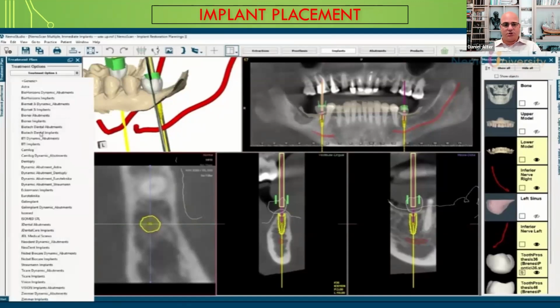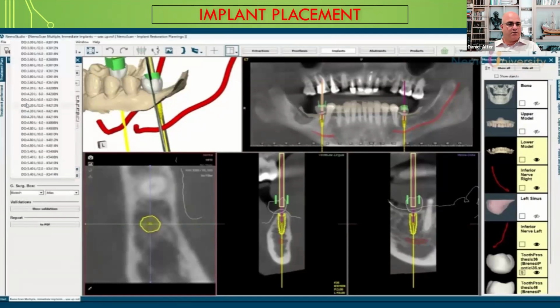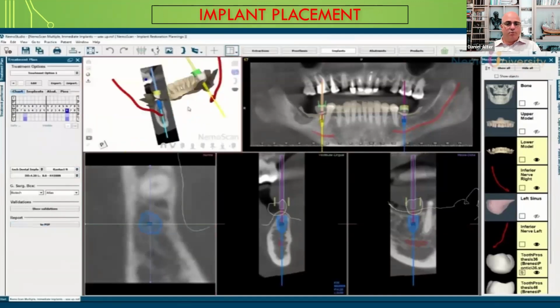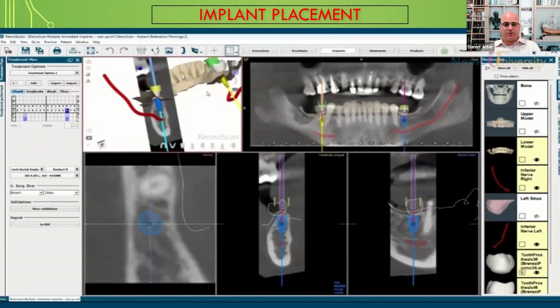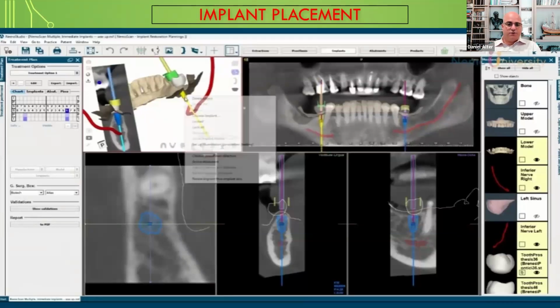We can accomplish a lot with the tool, but how does it benefit us? And what in particular does it benefit us? One laboratory may be looking at a different source of information than another, or one may find it more important to see it from one vantage point or perspective over another. But that's the benefit of this software, that it allows you to customize it to exactly the way you want to see it, so that you can achieve those repeatable and consistent end results.